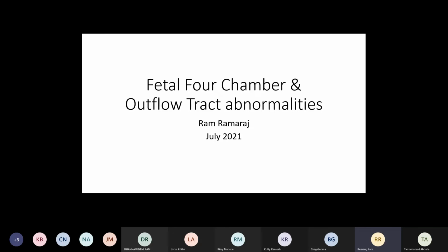rib shadows and baby shadows. So you might start losing what you can potentially identify before 22 weeks. So up to 22, 23, 24 weeks, you could see and give them a full diagnosis, and that's the ideal time.